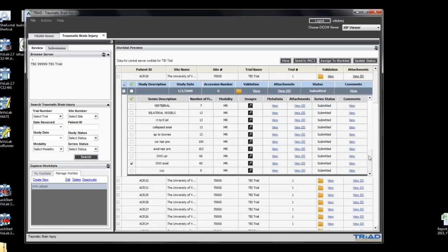So what we did at Siemens Healthcare Solutions was to develop dedicated software for TBI. This software was for requirements quality assessment. So we're going to show some features of the software today.